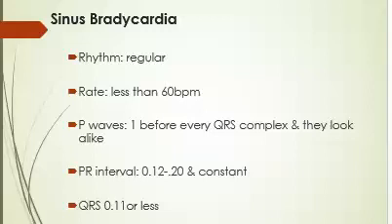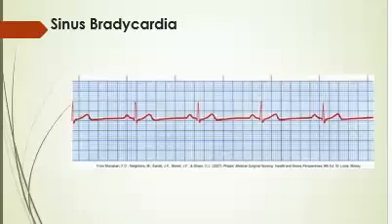Okay, so this is the part that isn't all that fun, but we still have to cover it, because when we start getting to the more complicated rhythms, I need you to understand that. And this is how sinus bradycardia looks.